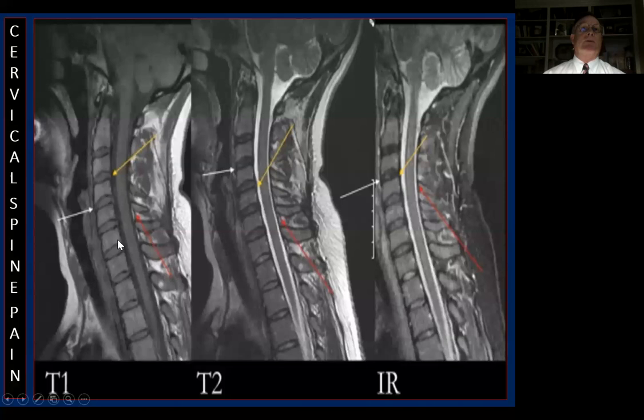Now here's a patient with straightening of the spinal axis, and basically you're able to see the marrow signal. A little Chiari 0, kind of low-lying tonsils, not bad. Water weighted here, and then fat suppressed here. And again, we talked about the things we want to see: you'll see occult stress-related edema and bleeding on this fat suppressed image. Even though T1 is fat weighted, you see fat really well here.